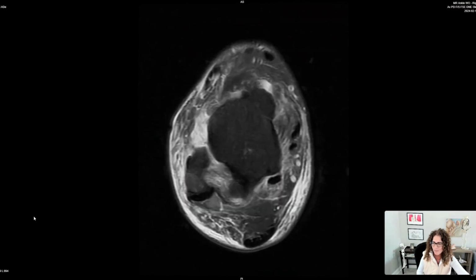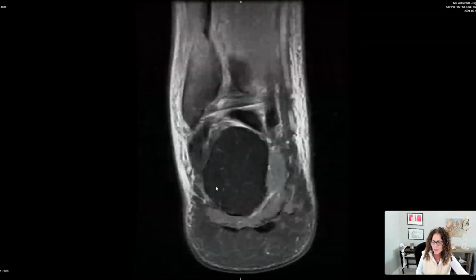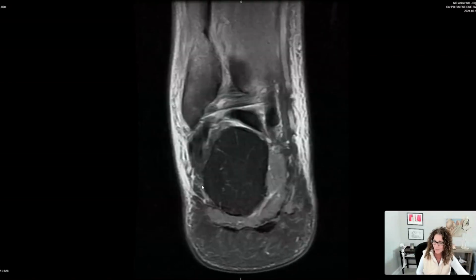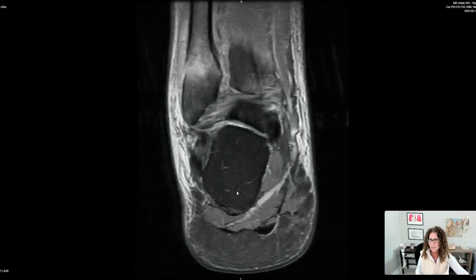So right now, I have a solid SER stage 3 and going towards a stage 4. The thing that's holding me back from calling it a stage 4 is I really couldn't find a medial malleolar avulsion, but I do have a partial tear. So when I think about this entire thing and my impression, I would be talking about a supination external rotation SER 3/4 injury, and I would outline the features of the full thickness tears of the ligaments as I've described.